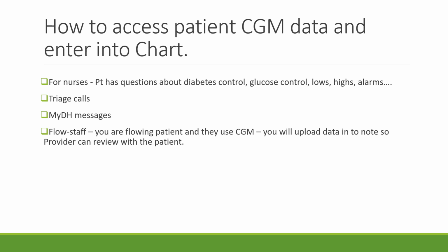It's January 2025, with a slightly new process on how to upload the continuous glucose monitor data into a patient's chart and into a note. This training is specifically for nurses and flow staff.